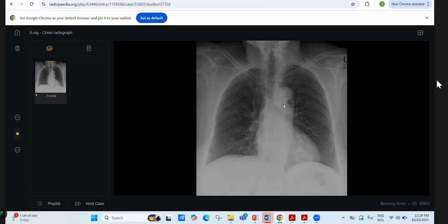About this retrocardiac opacity, I am looking at the soft tissue. I could not find any soft tissue pathology. The bones appear normal. So in summary, the findings are of a solitary pulmonary nodule or mass. This could be due to carcinoma. If the patient is a known case of any cancer, it may represent metastasis. So I will further evaluate this patient with CT to confirm this finding and further characterize the lesion.